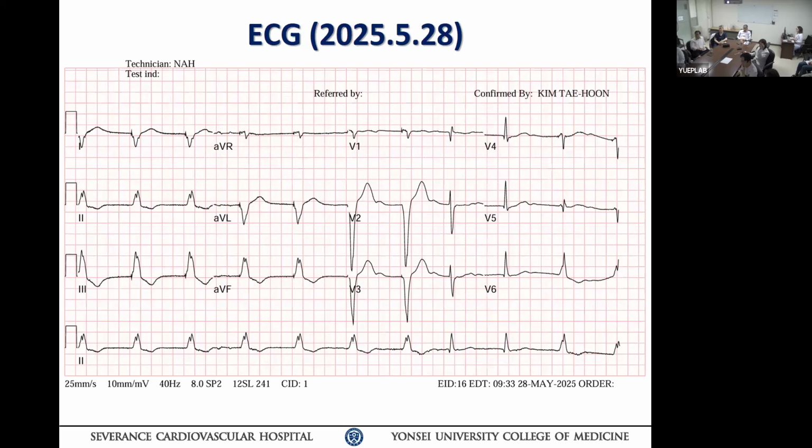Since the QT is long, the patient may be on an antiarrhythmic drug or some sort of treatment for atrial fibrillation. You can imagine that in your clinical history. Or the patient has an electrolyte imbalance, which can be responsible for the U wave. So this is basically a single chamber pacemaker, possible rate response, appears to be properly sensing, in a patient who has atrial fibrillation with possibly intermittent slow bradycardia, because the pacemaker is driving most of the time. So the patient most likely has symptoms, maybe even conduction disease. Maybe that's why they got the pacemaker.